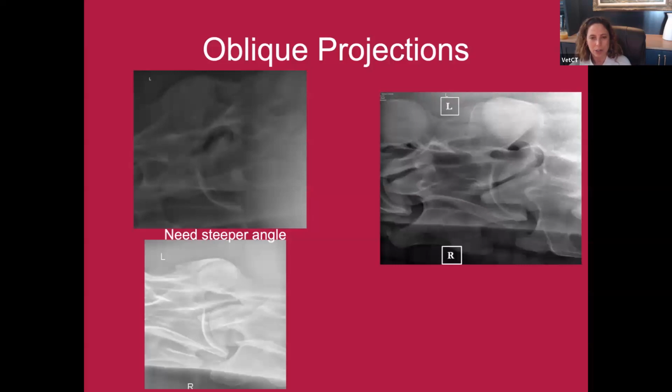Just a little bit on quality control here. So this is our well-positioned oblique projection. This is what we're aiming for. And we can see one articular process joint up, intervertebral foramen. The right articular process joint is down, which means the right side was against the plate. We can see the articular surfaces and the joint space. What I want to see is that joint superimposed on this C-shaped intervertebral disc space, and I want it right down the middle. And that's really important.